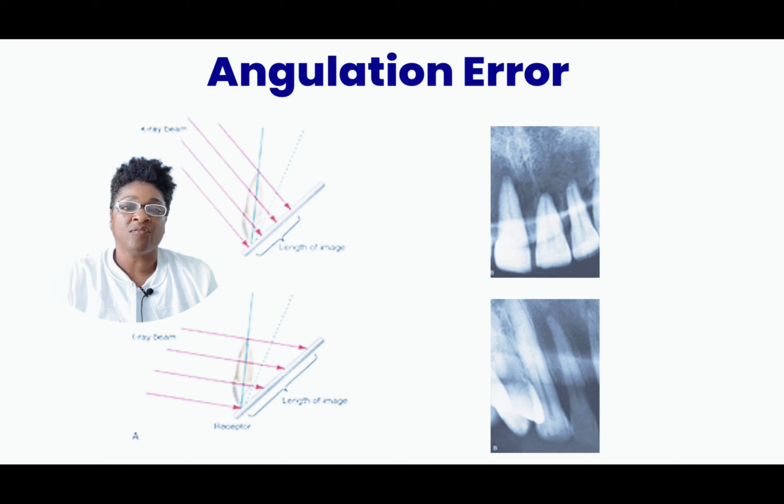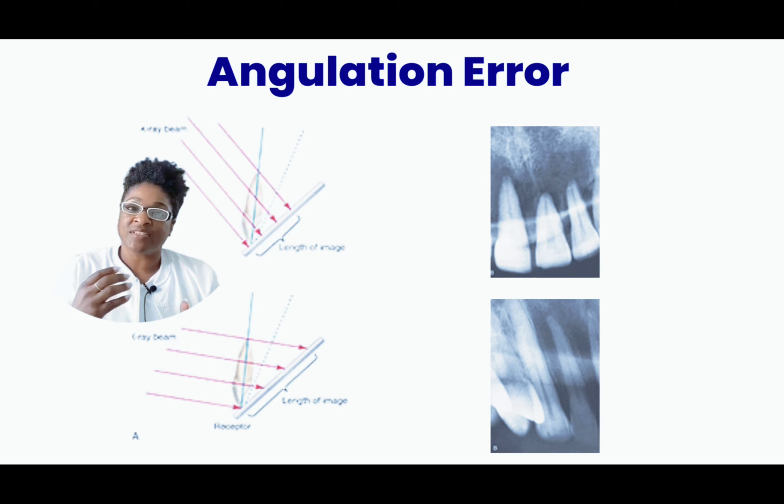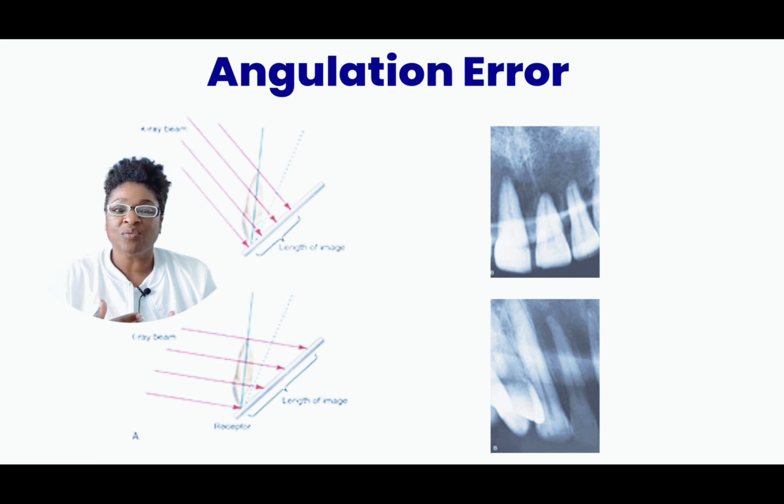So again, if you're on the maxillary arch and you're taking a PA of one of the teeth on the maxillary, then your PID will probably look like it's just dead on, like it's parallel or right lined up perfectly with the cheek. Again, if it's not angled, pointed down or up enough, in this case, pointed down enough, then it's going to make the teeth look really long.